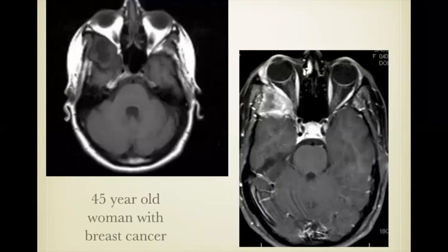This is a case that I came at from the other direction. This patient was referred for an MR scan because she has a history of breast cancer and was having worsening headaches. On the MR scan, you can see on the T1 weighted study this expanded portion of the bone here. On the contrast enhanced scan, you see it's bulging into the orbit. It shows this pattern of enhancement, very worrisome in my opinion. And we did broach the question of whether this could be metastatic disease.